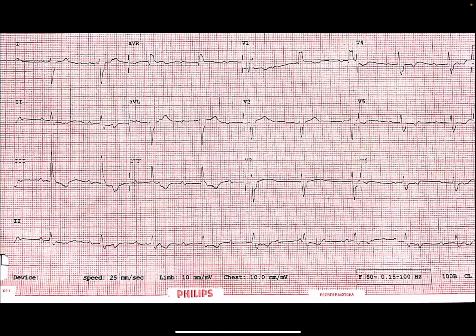Okay, so what is this ECG showing? I'll read the ECG for you. So this is a 12 lead ECG showing regularly occurring P waves and regularly occurring QRS complexes with no relation between them, and the axis of the QRS is a right axis. There is an RBBB type of pattern here in V1. If you see V1, the positive deflection is there, right? So it's an RBBB type of pattern.